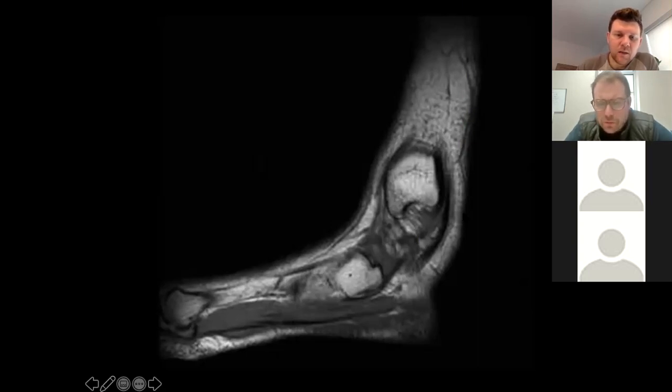All right, so the mouse right now is overlying which tendon? Yeah, that. I guess I can draw. Good, the posterior tibial, right?